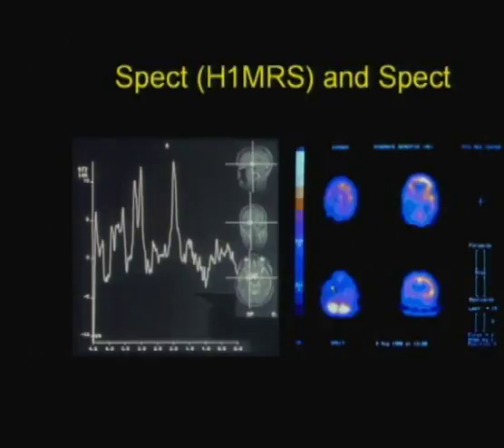Characteristically, you will see severe depression of temporal lobe metabolism if you're using FDG or another glucose analog with PET scanning, or with SPECT scanning, you're going to see a marked decrease in perfusion and metabolism of the temporal lobes. Notice this is reversed, this is left, and this is right. Notice again in this patient, it's the left side that's markedly involved. The right side is also involved.